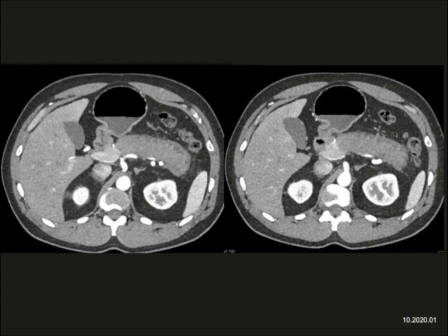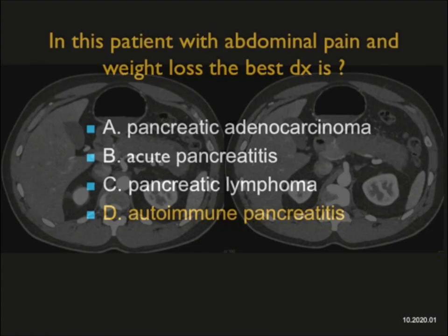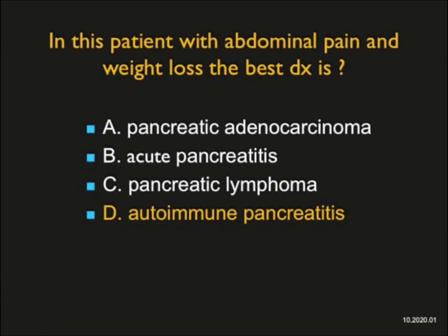And so with autoimmune pancreatitis, you have a halo, you have diffuse enlargement of the gland. Remember, treatment with autoimmune pancreatitis is simply steroids for 2 weeks, and then the pancreas will decrease in size. This case, I don't think I would confuse with a cancer, but remember, at times, autoimmune pancreatitis can be confusing with a mass, as it can present as a pancreatic head mass, for example, with dilated pancreatic duct and dilated common duct.